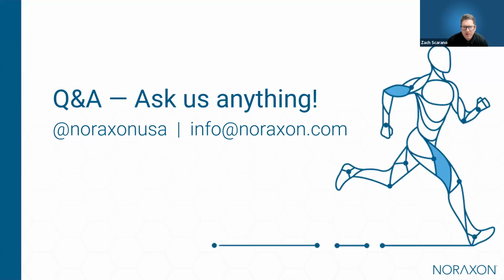Of course, there may be opportunities to add additional components for real-time biofeedback applications, whether that be the smart leads from the Ultium system or the inertial sensors. But as it stands today, this application is specific to the Noraxon EMG sensors only, so only providing that EMG biofeedback.